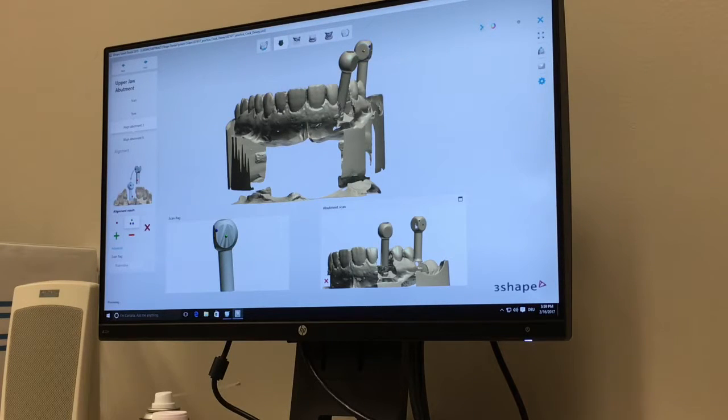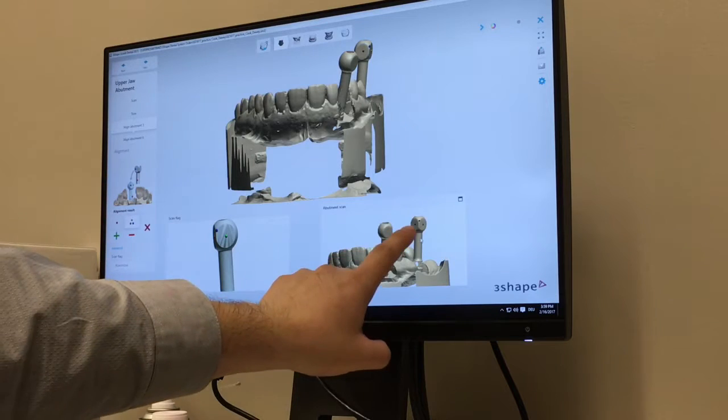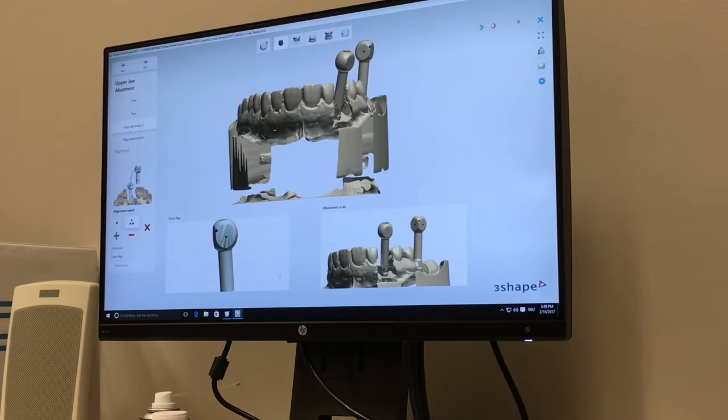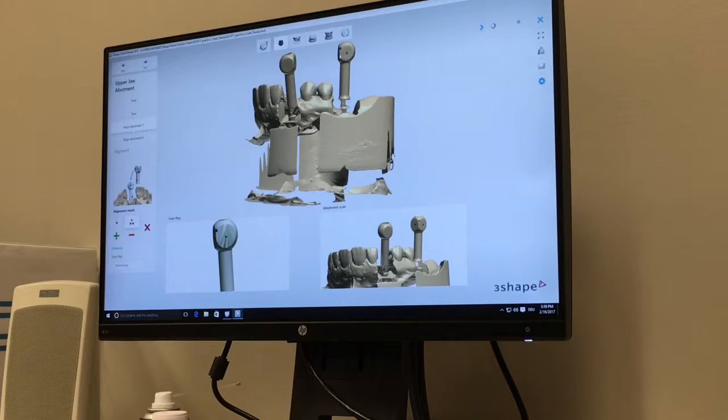I don't know if you could see that dot, this dot moving corresponding with that dot. So you can either move these to match up with those, or you can move these to match up. All right, just look at them. They are really, really close.